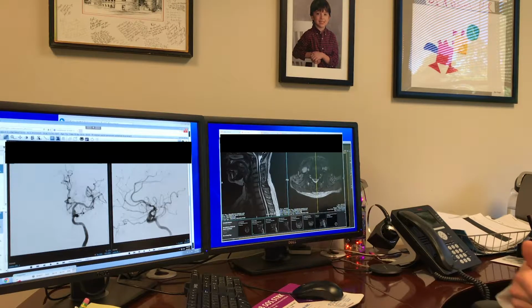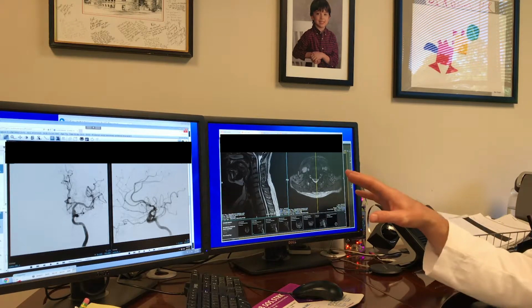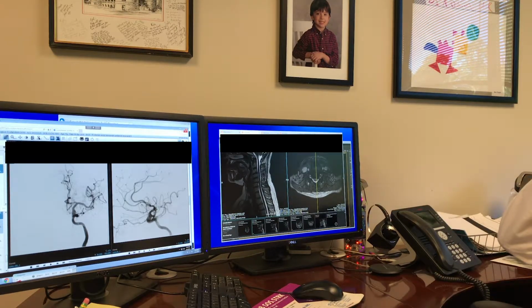We can do venous angiograms, but you're going retrograde against the blood flow. When you're going this way, you're going above the heart, so you're going with the blood flow up into the brain. But primarily what we do is on the arterial side, because aneurysms are on the arterial side, fistulas, all those things are primarily on the arterial side. So that's why it's an arteriogram. But every once in a while we will get to the venous portion.